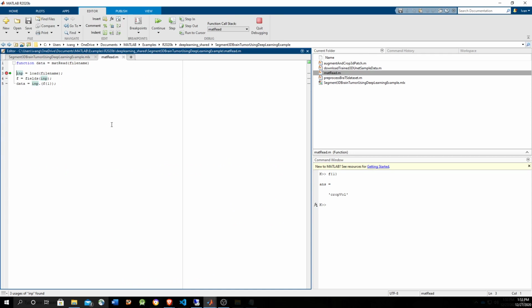And now we are in the label. And again, the label has a structure, crop label, the fields, which is crop label, take the first one. And notice that the label, instead of being 4 dimensions, is 3-dimensional. It's a logical array because the values of the tensor are going to be 0 or 1, 0 indicating no tumor and 1 indicating tumor. Okay, so let's just hit F5.